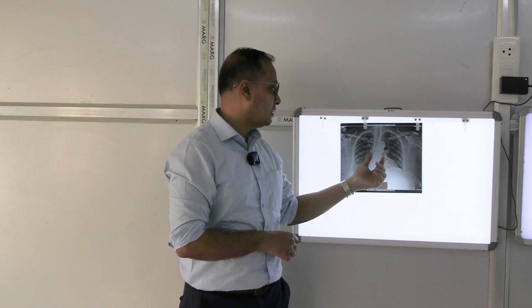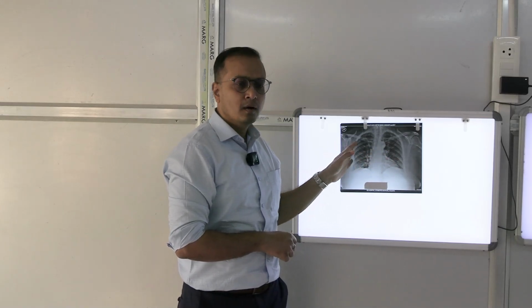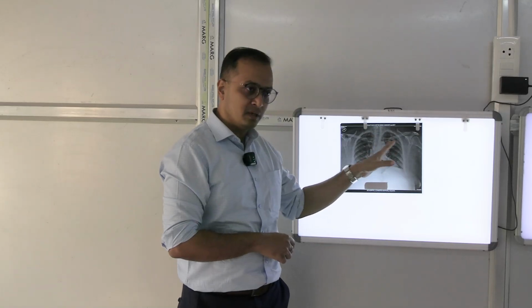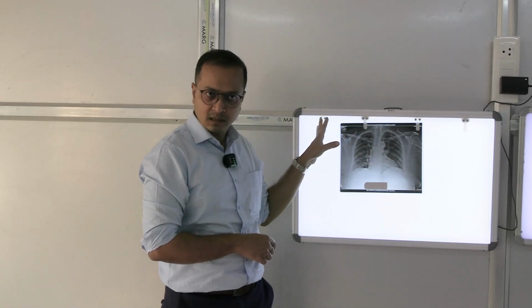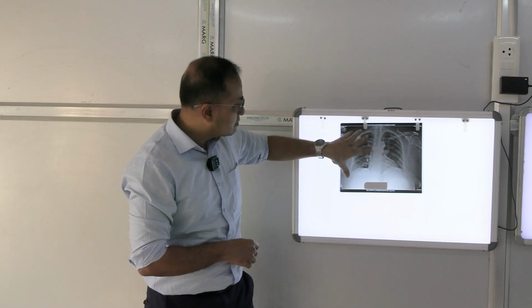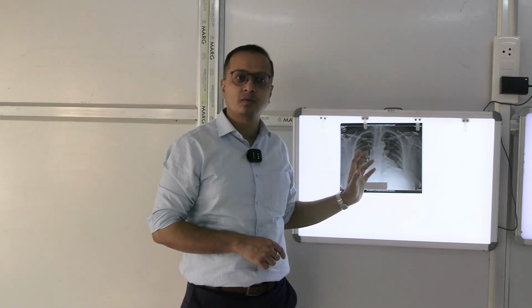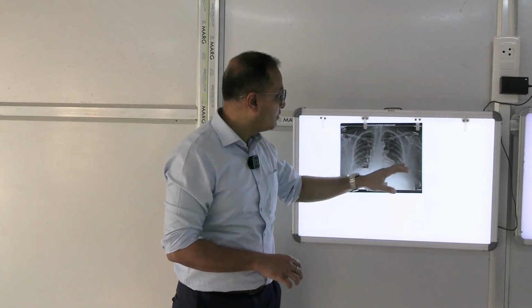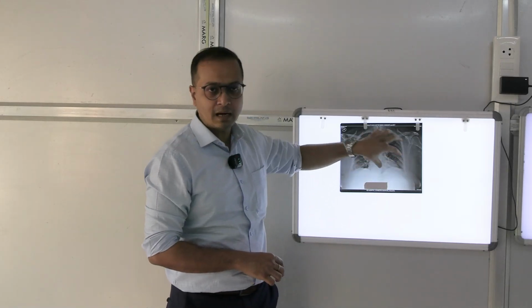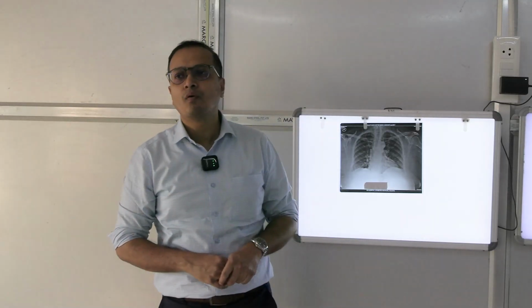Here we have this irregularity marked by lymphatics along with the bronchus, which splits into the principal bronchus, segmental bronchus, etc., going in along with the blood vessels. We also have intrapulmonary lymphatic channels. Together they make up this lung shadow, the black shadow, within which we see markings that we call bronchovascular markings.